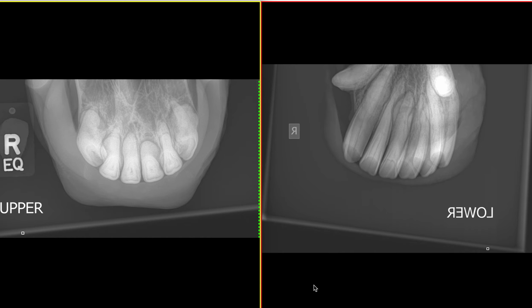Today's example is a 19-year-old Warmblood gelding who's been eating slowly and is reluctant to pull the hay from the haynet. Once you've reviewed your radiographs using your systematic approach, then you're ready to watch this video. I'm going to highlight the most important findings for the teeth in this case, and we'll talk a little bit about nomenclature and naming of the teeth as we're going along.